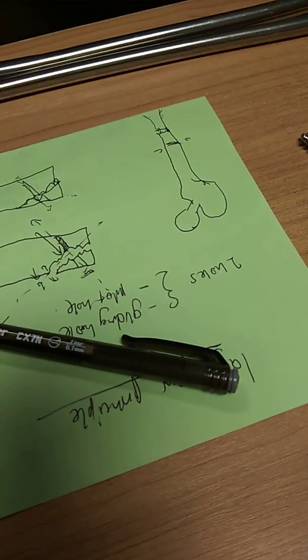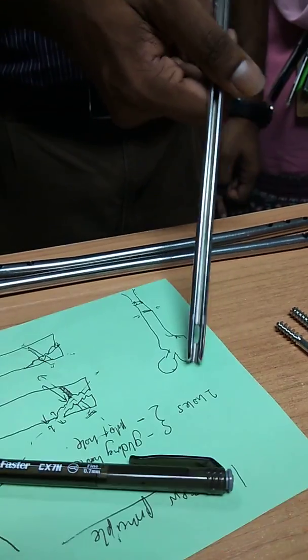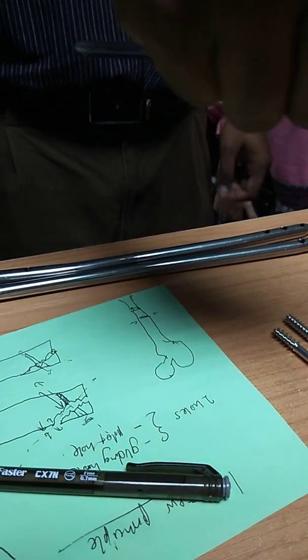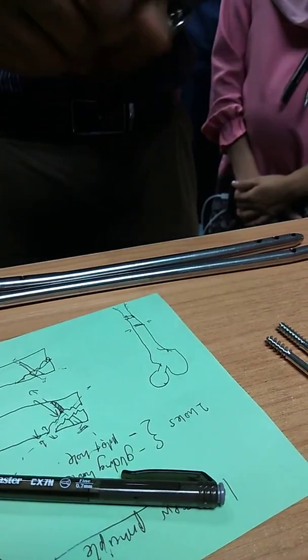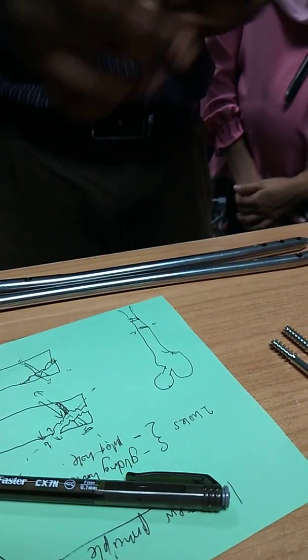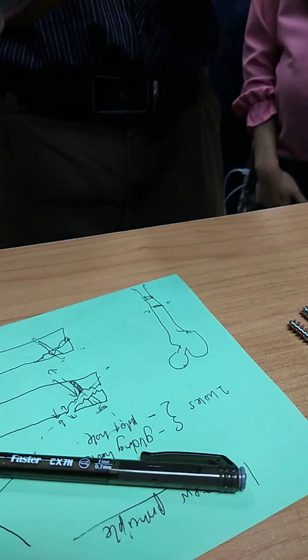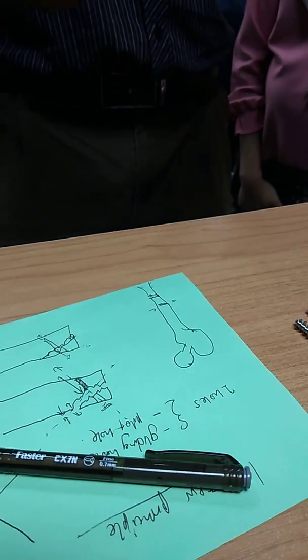Okay. So if the fracture is there, then we can open up. It's not percutaneous, but you have to open the fracture site and then retrograde it. You have to knock it in here first, then you have to reduce the femur, and then you knock it down. So it sits in the center, but it's rotationally unstable because it can rotate inside. Whereas for ILN, it's more rotationally stable because of the presence of the interlocking screw. Okay, which is placed proximally and distally.